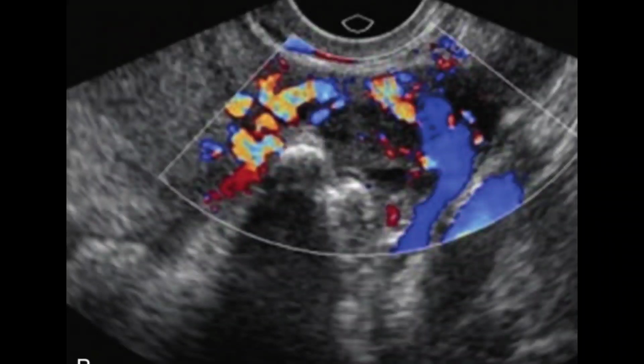So you have to write the ovary size. Also mention that the fallopian tube is mildly dilated and the surrounding structures show high vascularity. So, keeping in view the increased vascularity and mildly dilated fallopian tube, the findings are suggestive of pelvic inflammatory disease. Correlation with other inflammatory markers is recommended, and further investigation is also advised to rule out the real cause.